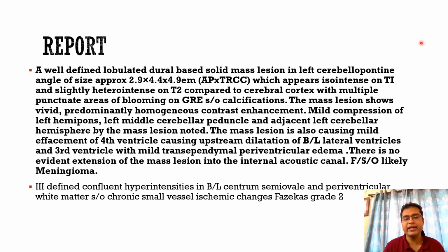There was no evident extension of the mass lesion into the internal acoustic canal, suggesting diagnosis of a meningioma rather than a schwannoma in the left CP angle. There were some ischemic changes in the brain as well.